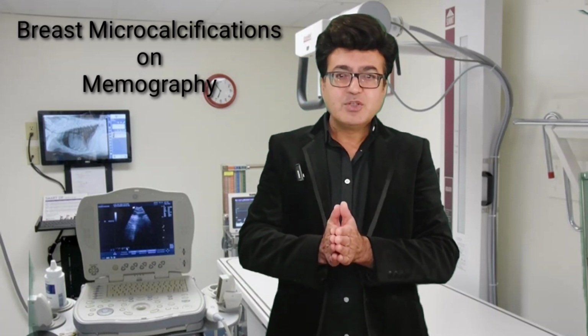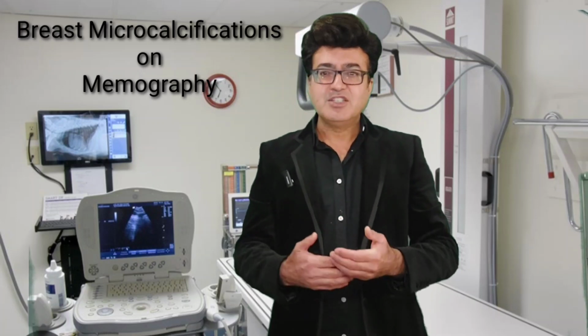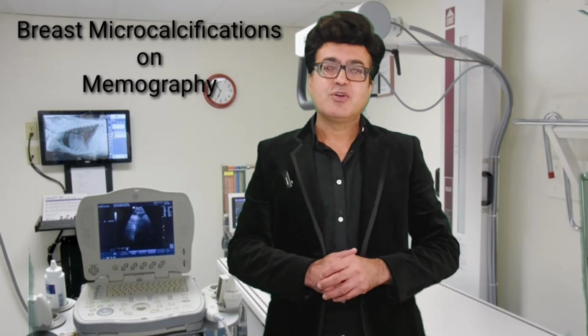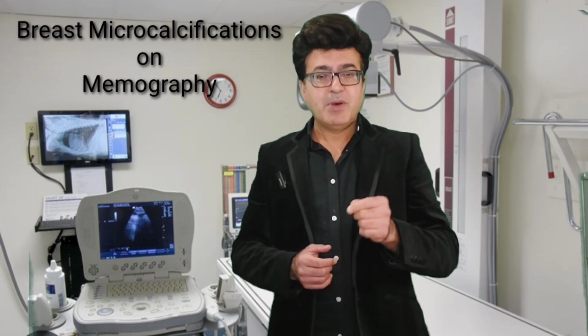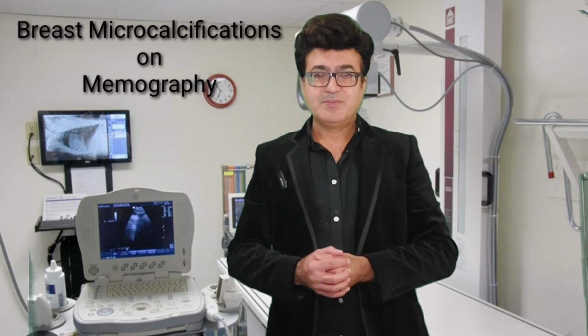If there is an abnormality related to fat necrosis, it will appear as an eggshell calcification. In some other conditions like skin calcification and inflammatory calcification, there will also be a particular style, shape and characteristic of the microcalcification. How we will appreciate them on the mammogram images. So let's start watching these images.